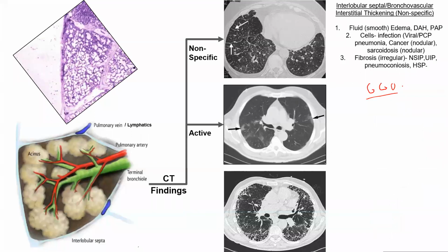So ground glass opacities are basically something going on in the lung that really can't be totally seen and totally outlined by the CT scanner because it's at a lower resolution. So what it does is that it ends up kind of partially obscuring the lung.